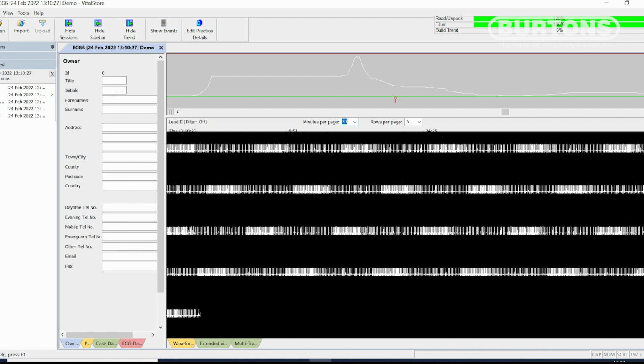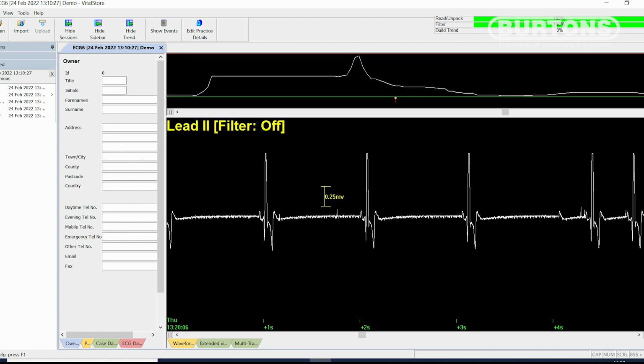As you remember, this recording is an ECG on a recorded loop for demo purposes, so we've got some repeatability. It's increasing in heart rate, slowing down, increasing, slowing down, and this is the loop you can see being repeated here. But let's say this is an overnight recording and we're looking at some of this data to see whether we think there's an anomaly occurring. We may see something here, for example, and say I want to jump to this point. You double click on it and it jumps straight to that point in the file, so you can then start to look more carefully at that portion of the ECG.